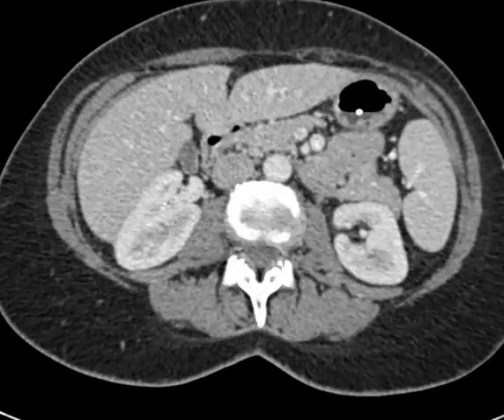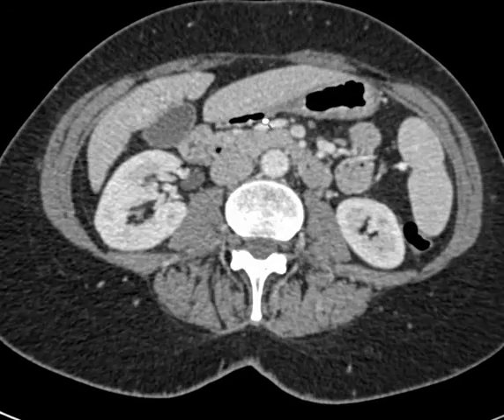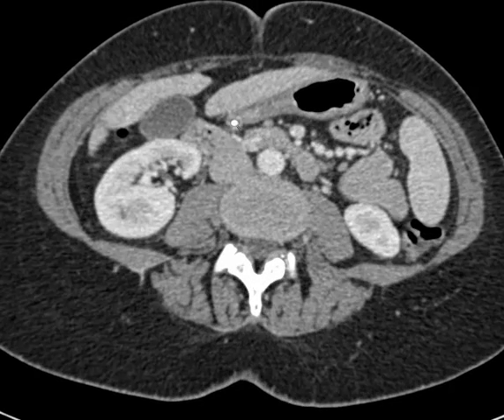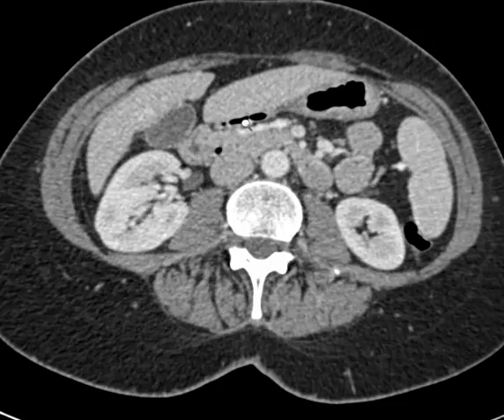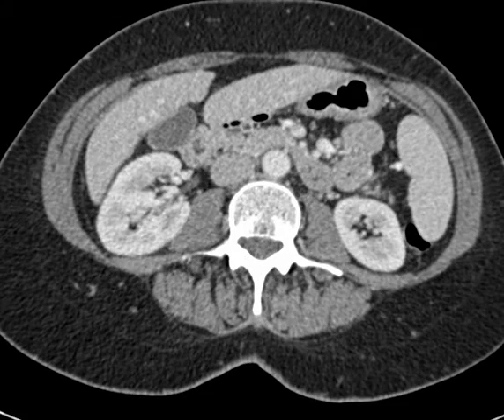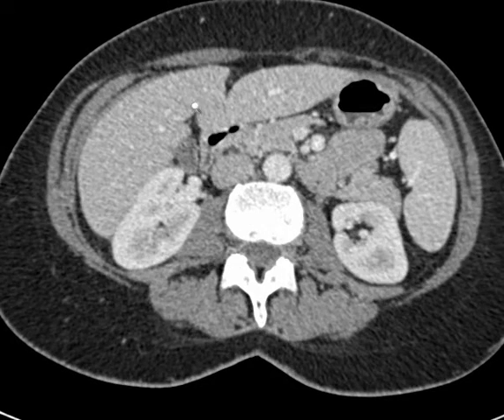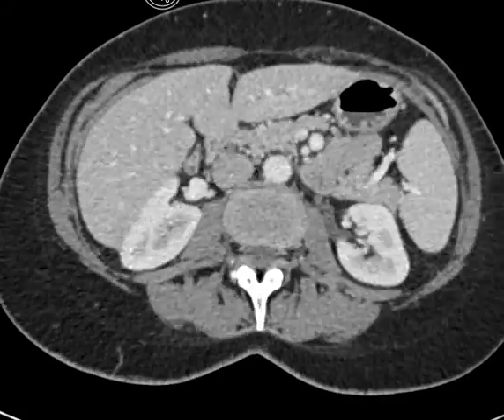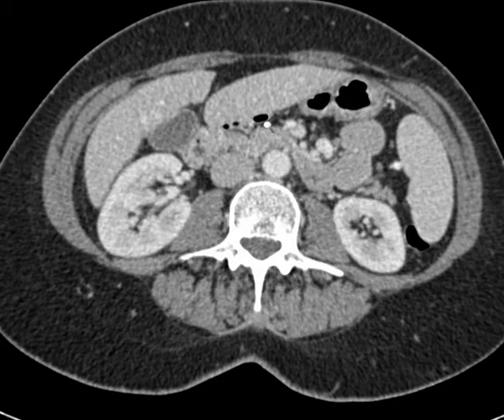Continue on and see now stomach all the way over to here. It's going to cross back over to the right side of the patient. So here's again stomach right here. I'm just trying to keep the cursor right on a portion of it so that you can see. Now I'm going to scroll a little bit to where you can see that it's communicated now with the duodenum. So this is the duodenum. Let me just scroll back and forth so that you can see that. It's a little bit tough to see because the stomach is so collapsed. So here again, stomach to duodenum.